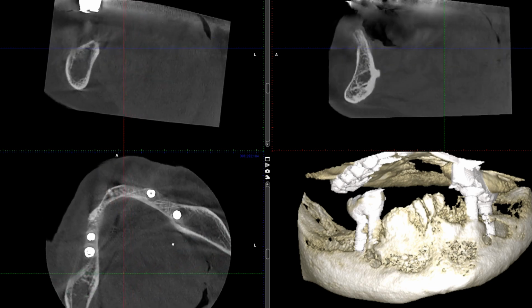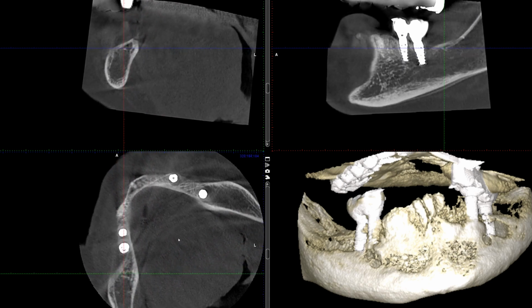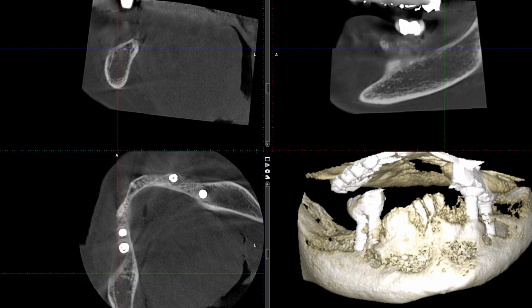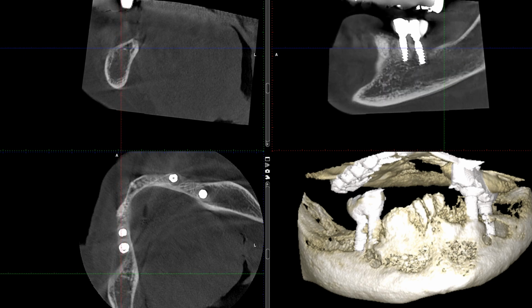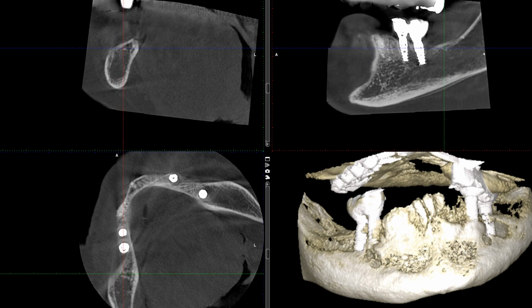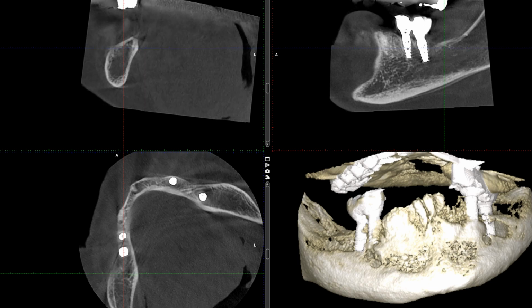As I turn the volume in order to look at a corrected sagittal view, here from this corrected sagittal view you can appreciate the amount of bone loss this patient sustained over the course of her life. I do not know whether this patient is on anti-resorptive medication, but based on its appearance, I am quite certain that this patient has osteoporosis, or at least osteopenia, and we would expect that in someone in this age group as well.